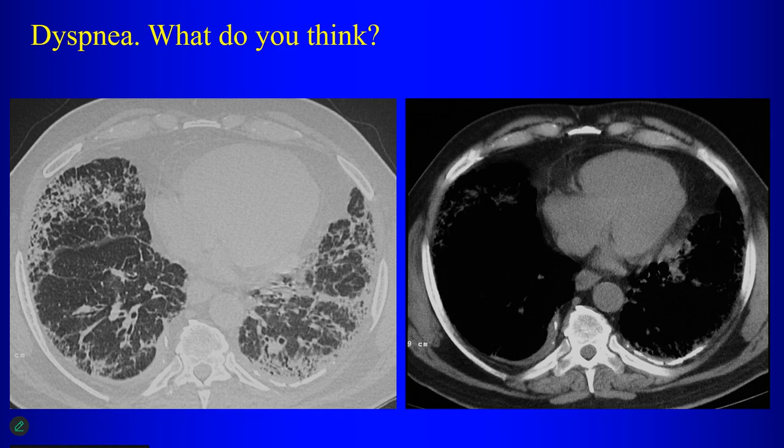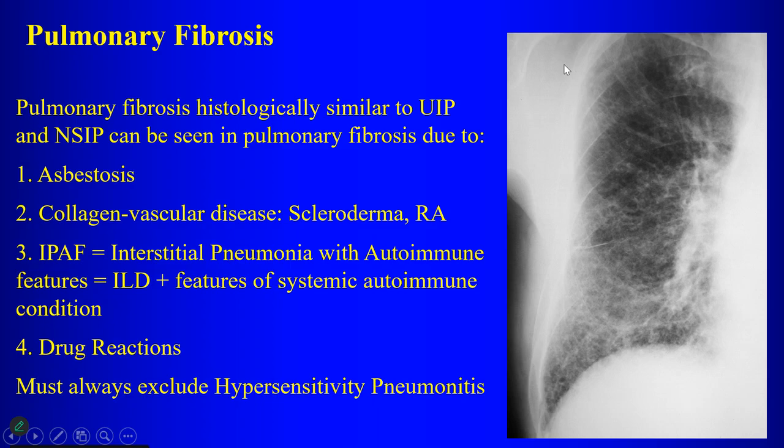Okay, so what is this? This is asbestosis, right? Asbestosis can also give you fibrotic disease in a lower lung distribution, and can look just like UIP. The key is: is there asbestos exposure? We have the calcified pleural plaques that tell us there's asbestos exposure. So here it's asbestosis. We're not going to say IPF for this case. Pulmonary fibrosis with asbestos exposure is asbestosis.